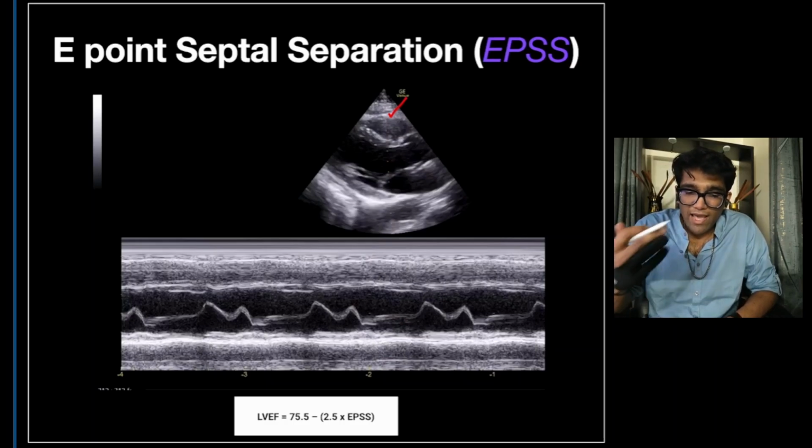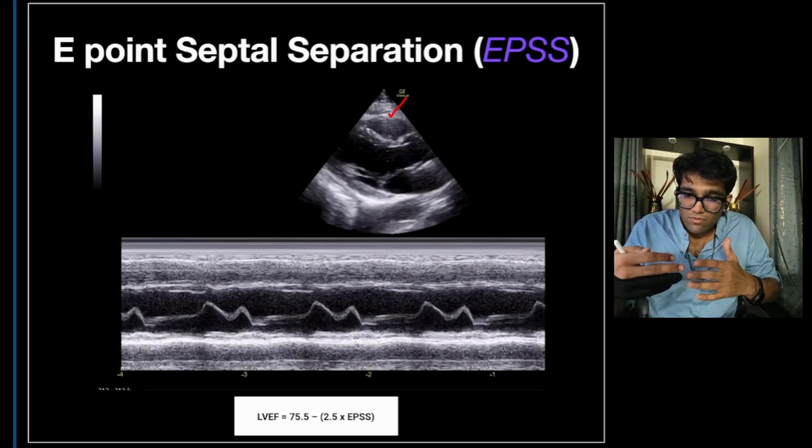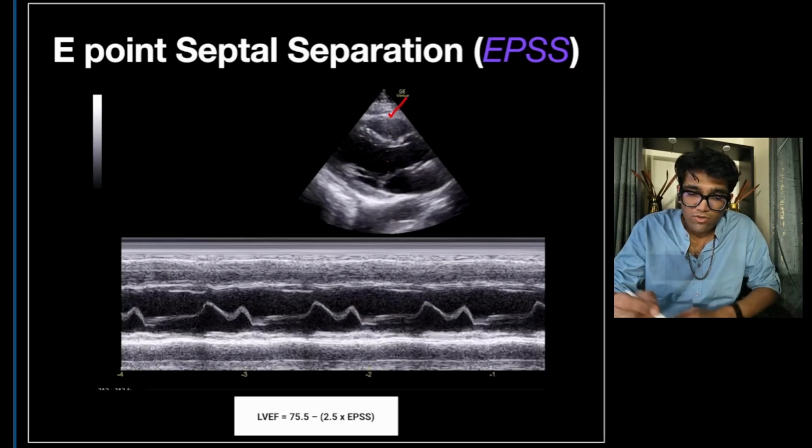And we know during diastole there is an early rapid filling. So the mitral valve moves, from our discussion in S1, very far into the left ventricle. Okay, and that we call our E wave, or your early rapid filling. So this is your E wave.